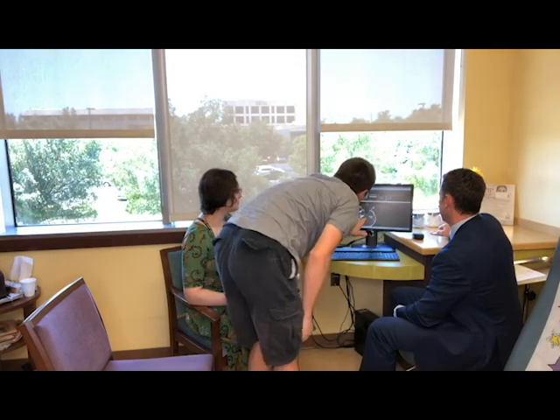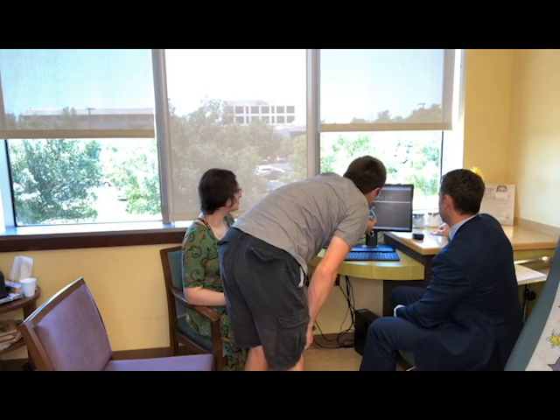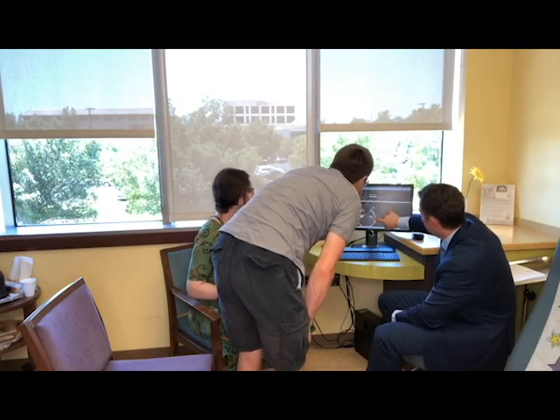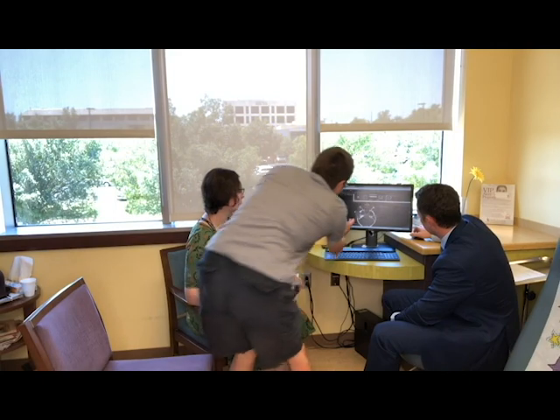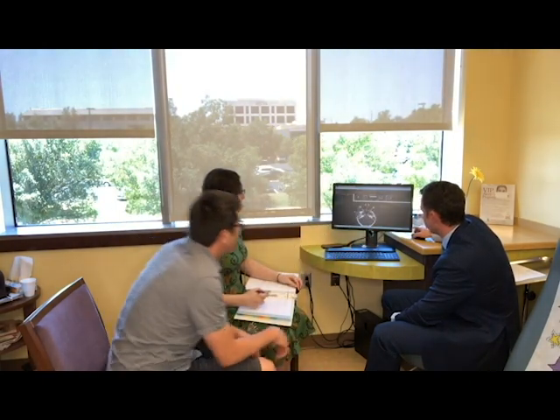It's almost like there's a piece here that's missing, that would normally be here. Yeah, this is exactly right. This is the temporal bone, and on the left is a very common picture. It almost looks like it's been replaced. Yeah, you're exactly right.